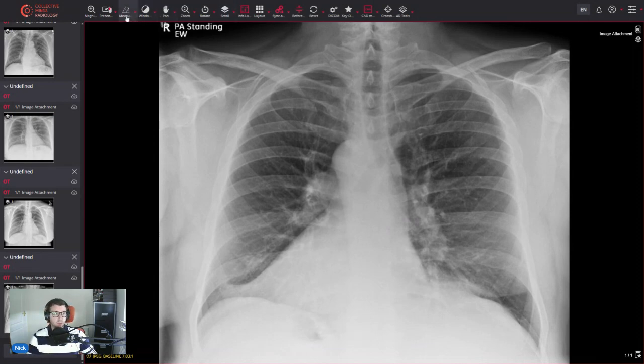So in this patient, we can see here we've got a gas bubble below the right hemidiaphragm. That implies that the stomach is on the opposite side. So this patient has situs inversus. You can get that with a whole host of conditions, but patients sometimes may present with just dextrocardia on its own, not necessarily situs inversus.